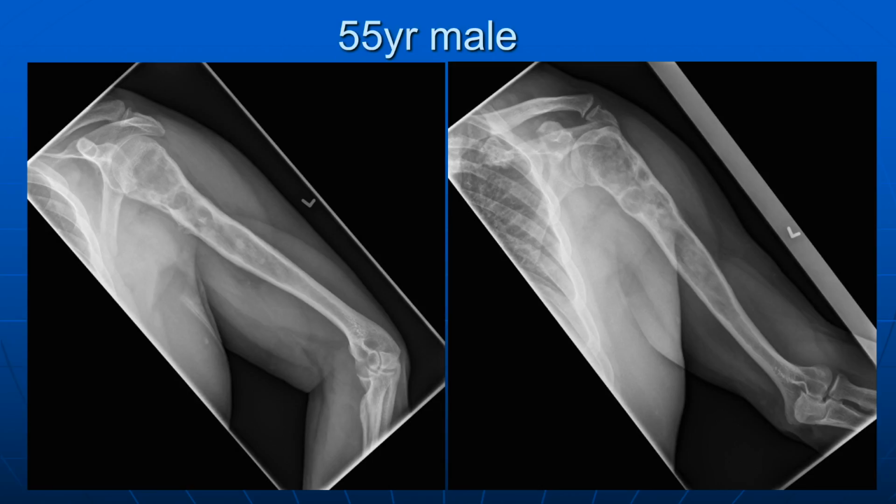I was talking about how if you get discontinuity of the bone, you have to explain why it's discontinuous. It's because something, namely tumour, has taken it away. So this is what we're seeing here. If the bone's discontinuous at any part, just think, could it be tumour? The other main mimic of fibrous dysplasia is a big cartilage tumour, and that's what this is. So this is a ginormous cartilage tumour or a chondrosarcoma.